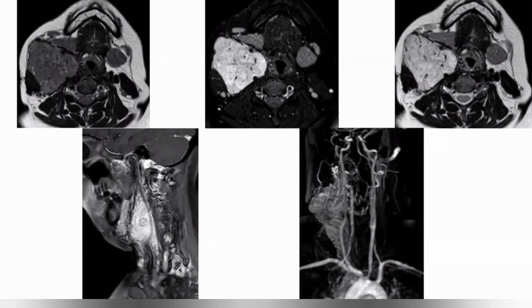This is a vascular mass, which is splaying the vessels, also involving the carotid bifurcation, and many collaterals are seen distal to it. The differentials, including the first one, is the paraganglioma, splaying the carotid vessels.